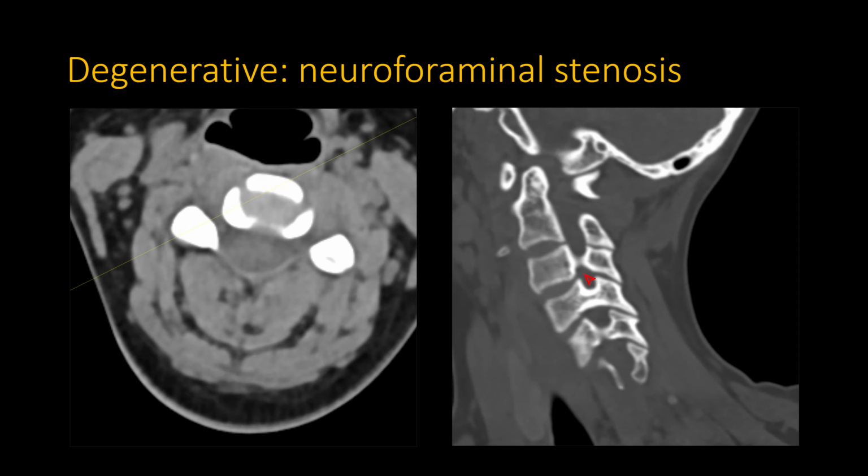As you can imagine, this can be pretty cumbersome, especially if there's superimposed scoliosis, or if the discs aren't really parallel. So you have to first align this to be parallel to your discs, then make sure this is sagittal to the discs, and then oblique this one to be on the cross section of the neuroforamen. It can be pretty cumbersome.